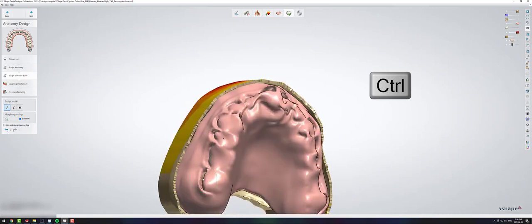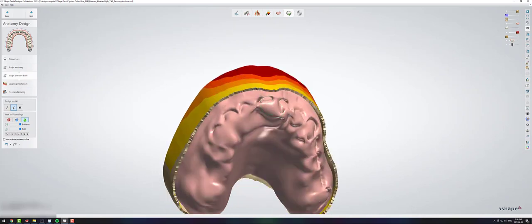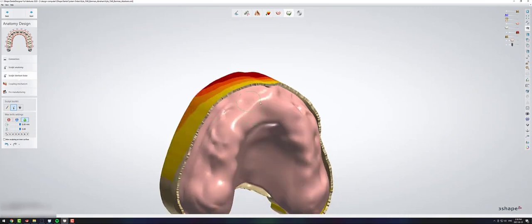And you're going to go over to your wax tools, go to smooth, and crank it as high as it will go, and smooth out all of those mountains that you just made. And you can see, even if you have really big holes in your wax-up, this can fix it in 30 seconds, no problem. And obviously you would have to go through and wax up the rest of your base, but this is a quick way to patch those holes up.